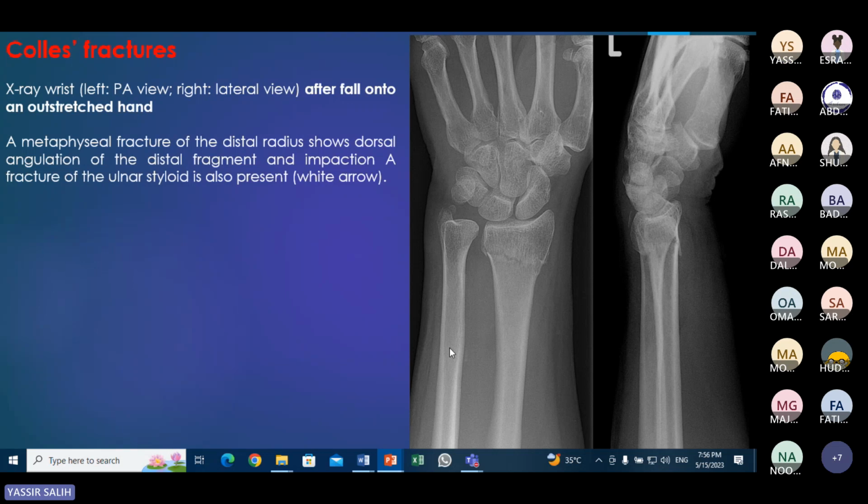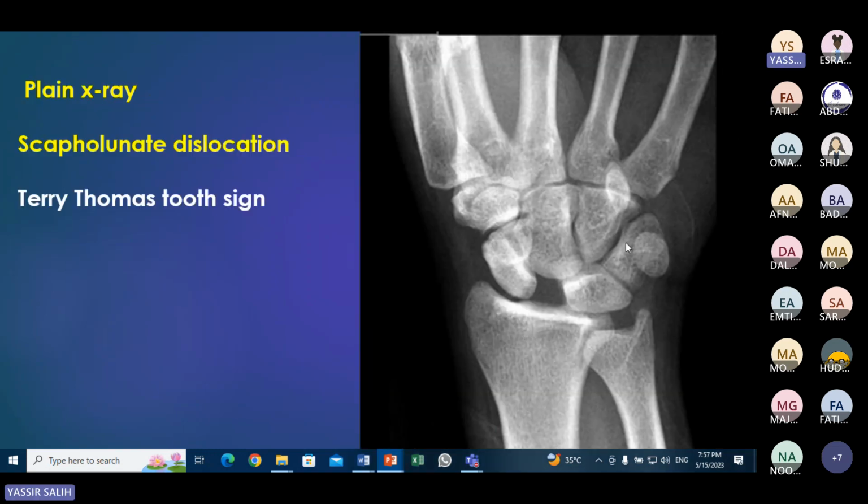In contrast, what is this? Colles fracture. Yes. Colles fracture is characterized by posterior displacement, وهيكون نفس اللي fracture in the distal radius، لكن بس الانجوليشن زي ما قلت انت posterior. لاحظ الانجل دي، this is posterior، اللي هو dorsal angulation of the distal fragment.